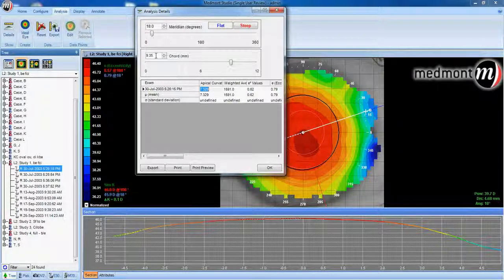And we measure sag, or the height of the cornea, from that point. If you click on the flat meridian, we can read the sagittal depth along the flat at 1591. Along the steep, we measure 1608. The difference between our flat meridian in height and steep meridian in height is approximately 17 microns, which is a very small amount. The threshold where a toric lens is generally required in orthokeratology is in excess of 50 microns.